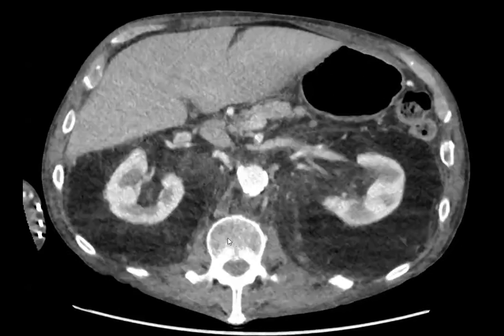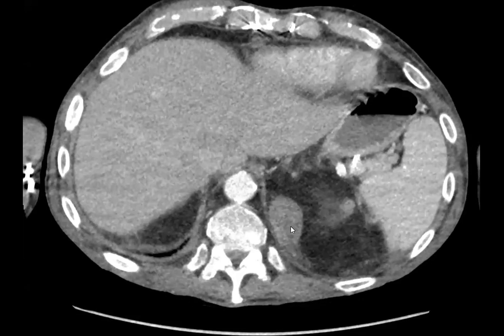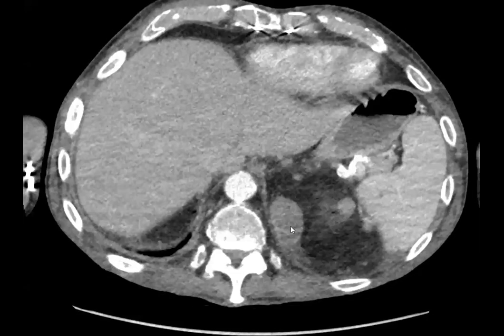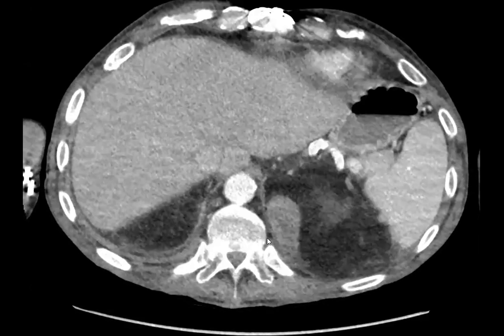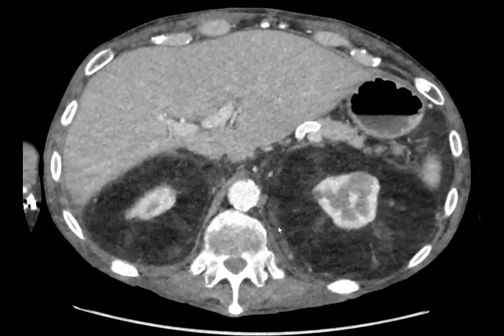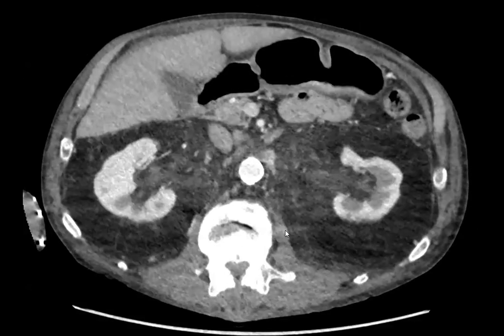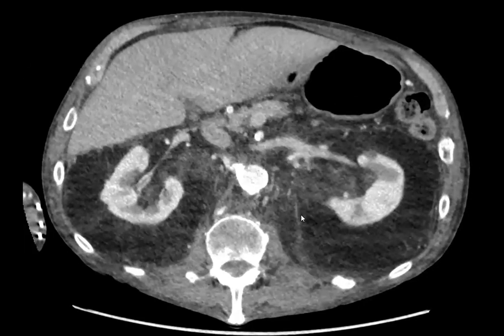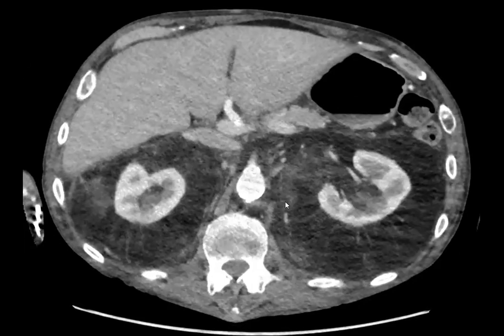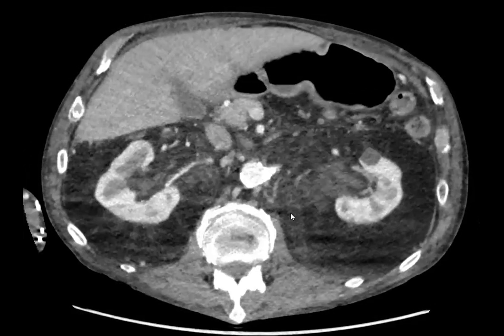So anyway, with this paraspinal soft tissue, this turned out to be extramedullary hematopoiesis. It loves the pararenal space, but it also loves the paraspinal areas. All of these things would be in the differential. For extramedullary hematopoiesis, you always look for a reason that their bone marrow is fibrotic or failing and that they need to have the activation of the extramedullary myeloproliferative cells. So yeah, that was it.